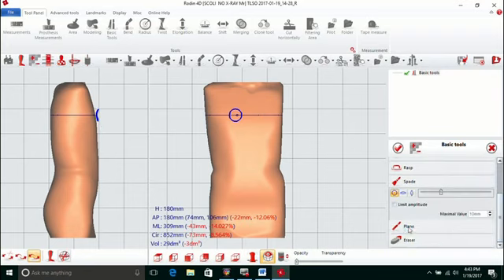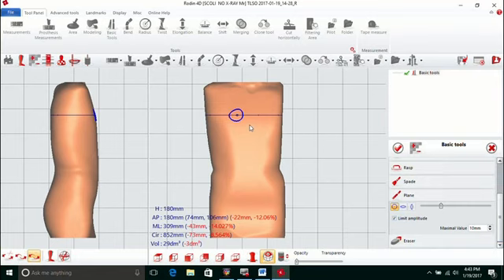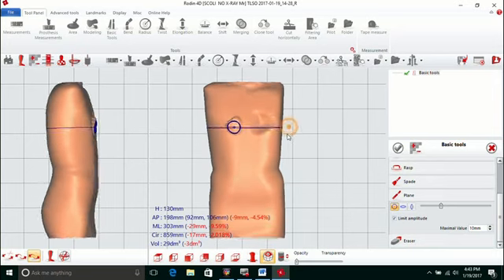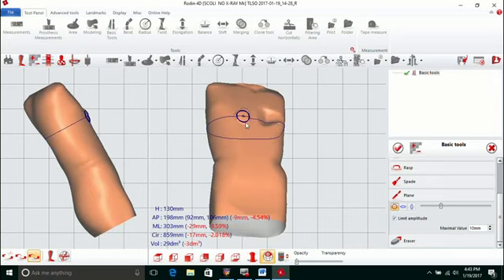Now we come down to the plane. This is the opposite now. This is going to be removing material, like a draw knife. So if I left click and I keep holding down, it's going to keep removing and removing. Just like the Spade, I can also set that depth too. Default is 10, but I can change that to whatever I like. So I can hold that mouse down for as long as I want, and it's only going to remove 10 millimeters.